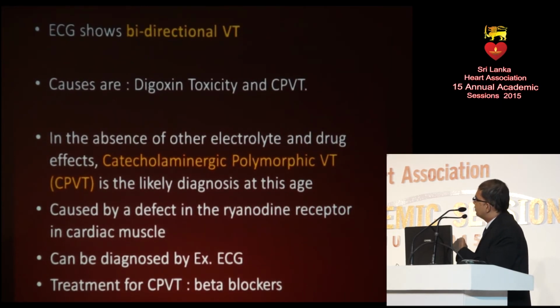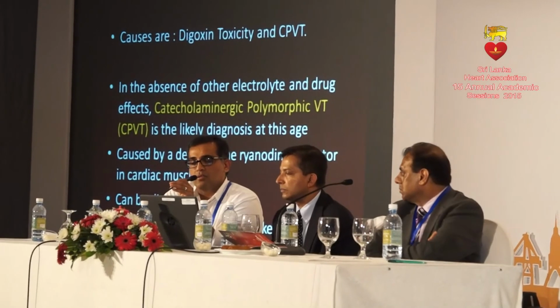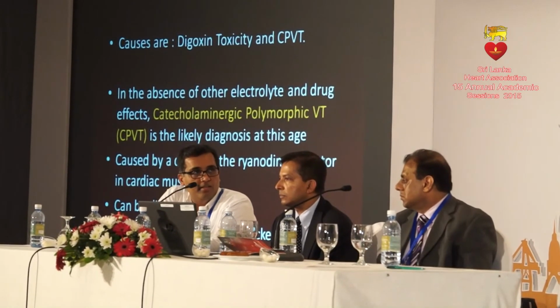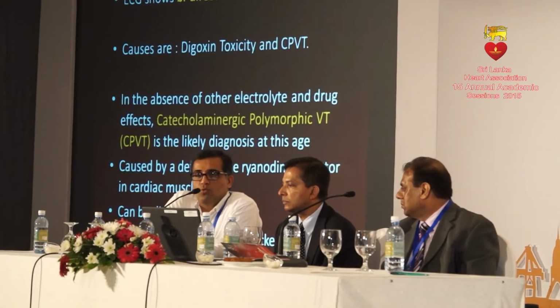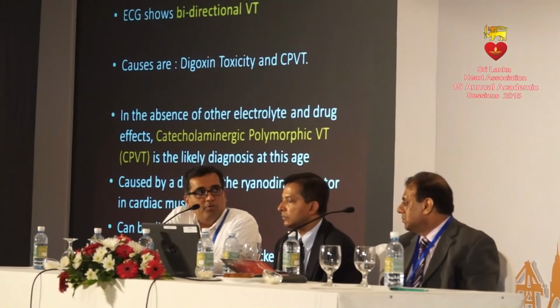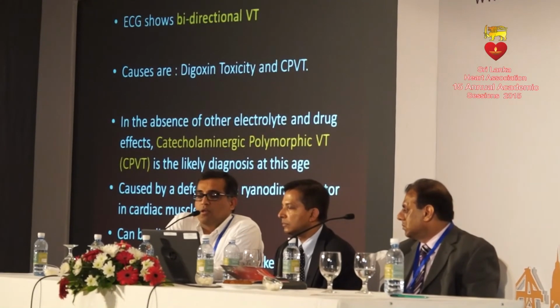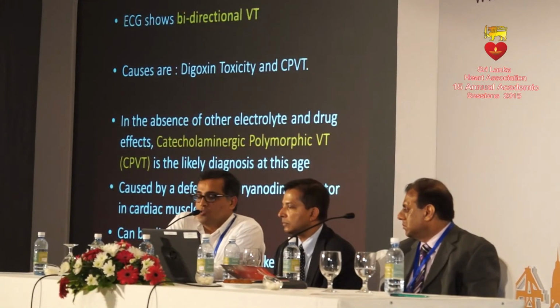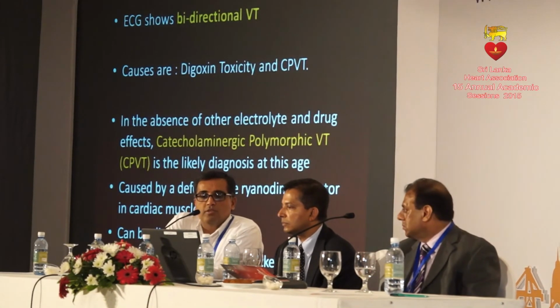What about any comments on this, Doctor? The fact that it's a 10-year-old boy is a giveaway. Yeah. There are only two things that should come to our mind when we're looking at this bidirectionally oriented ventricular tachycardia or a wide complex rhythm. One is digoxin toxicity, the other is CPVT, and I think it's pretty evident.